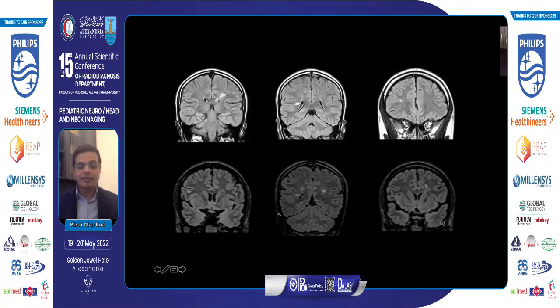And when you see lesions like this, which look like multiple sclerosis, it's a pretty good example of periventricular subcortical lesions, typically as you would describe in the context of multiple sclerosis. But all you have is headaches. This is a radiologically isolated syndrome. It's different from a clinically isolated syndrome. And what you're going to do for this is only clinically monitor these patients. They may need repeat imaging at some point, but you're not going to start multiple sclerosis therapy, even though the phenotype matches.